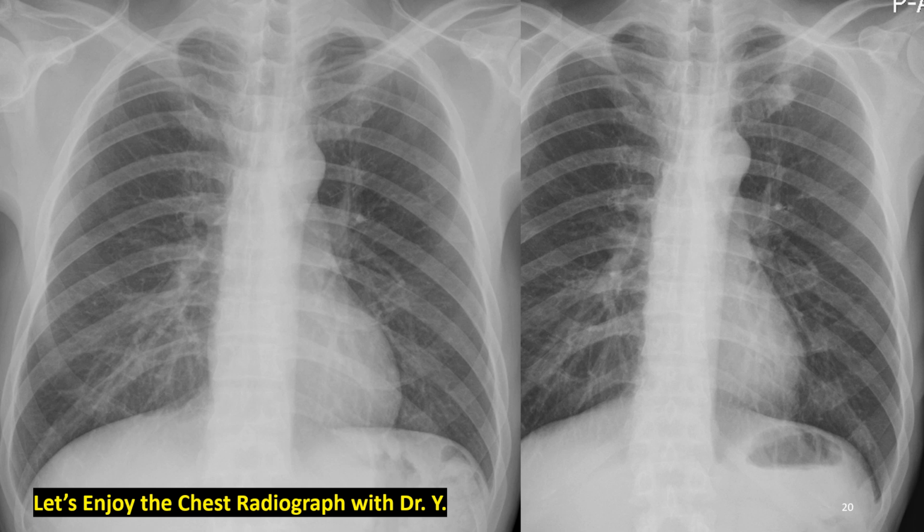Please look at this tumor. First costochondral junction. You got the difference? Yes, there is some difference. Slightly increased density, about 1 centimeter, in the first rib or in the lung. We don't know, but this is the difference.